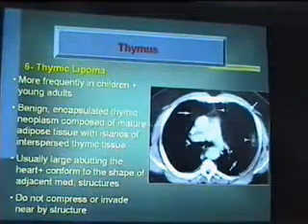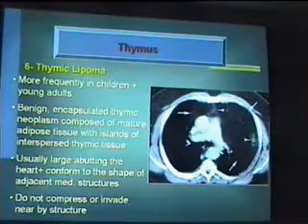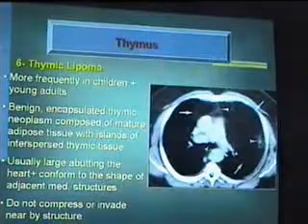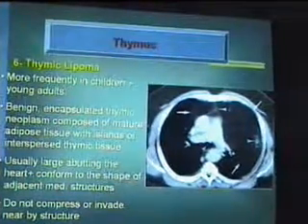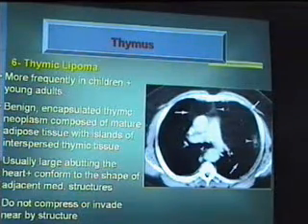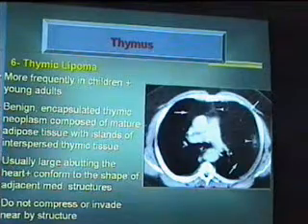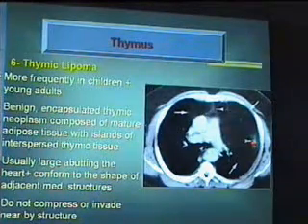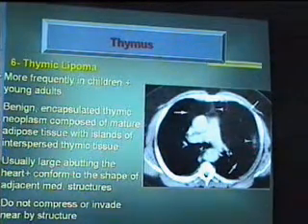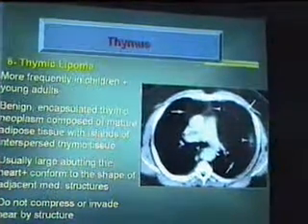Because it's very soft. يعني الفات ده very soft وما بيحتاجش يزق قوي زي other soft tissue structures التيومرز أو اللي هم بيبقى لهم قوام thick شوية، إنما الفات is very smooth. It doesn't do exuberant mass effect. وفي الليبوما عادة نلاقي فيه septa that enhances زي ما إحنا شايفين كده.